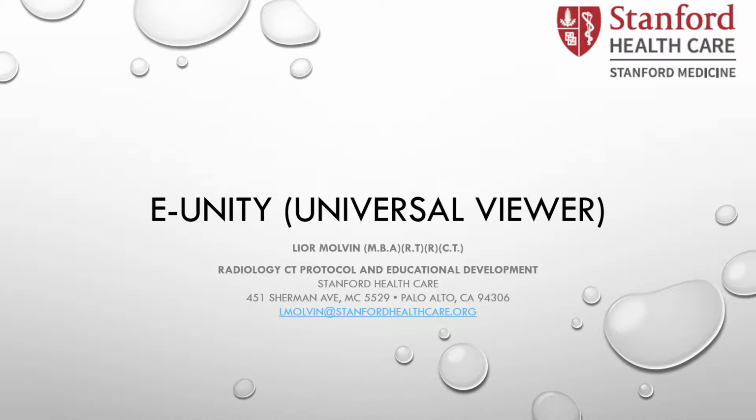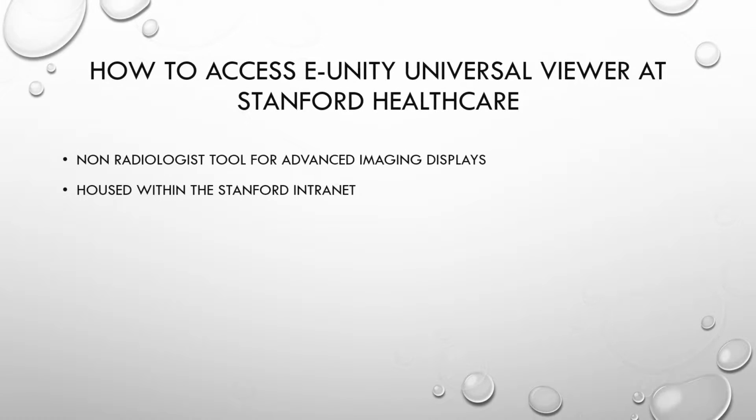All right, so we're going to go over the eUnity Universal Viewer for radiology images here at Stanford Healthcare. We're going to start off with how to access eUnity. It's a viewer that's made for non-radiologists to view advanced imaging like CTs, X-rays, MRIs, ultrasounds. It's housed within the Stanford intranet. I'm going to show you how to get there and a few things that you can do to use it properly.